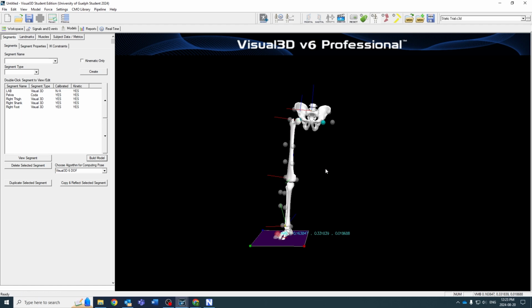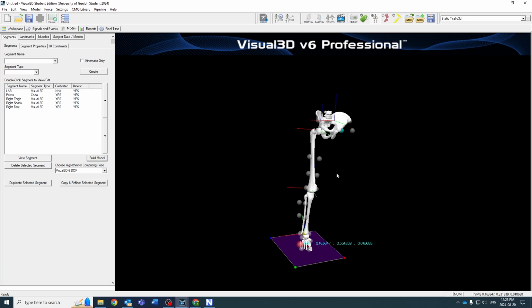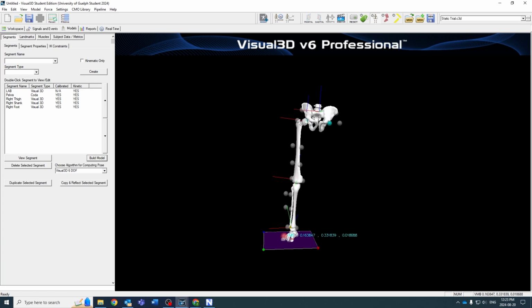The right thigh, we've used a joint center, and we had that equation in order to find the radius dynamically, which utilized the right hip and the left hip. We have tracking, two sets of tracking markers, 4 on the right thigh and 4 on the right shank, and these two were common.